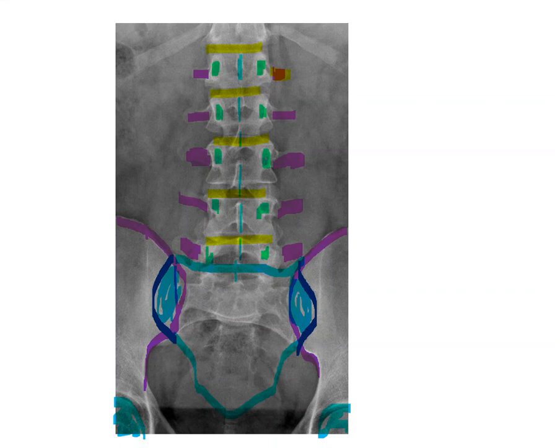Now, the intervertebral disc spaces are important because that tells us that the patient's spine was placed parallel to the table. If you're looking at your image and you cannot identify those intervertebral disc spaces that I've highlighted here, if those areas are superimposed with, say, the end plates of the vertebral bodies, then we know that the patient's spine was curved up away from the table when we took the x-ray, and that the spine was not placed parallel to the table. So I think that was all of the anatomy I wanted to go over.